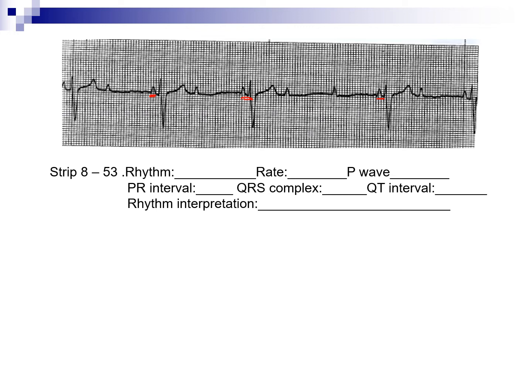So we want to rule out: it's irregular, so it cannot be third degree heart block where the R to R is always regular. The PR is constant, so therefore it would be a second degree type 2, and that's the only one that has a constant PR interval in the higher grade blocks. So we will interpret this as a second degree type 2 with a 2-to-1 and 3-to-1. So we see because we have 3 P's to this QRS and 2 P's to this QRS.